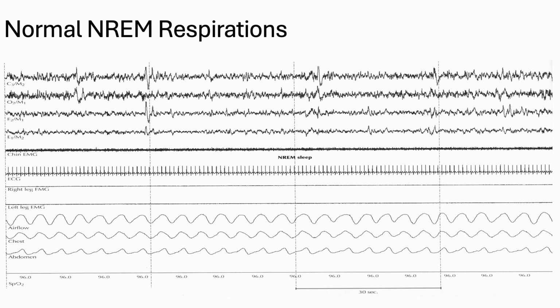Before we can really discern normal from abnormal breaths, let's look at normal breathing. This is a 2-minute window with 4 epochs. It's got those 4 big blocks of non-REM sleep and normal non-REM breathing. You can see an even and rounded morphology with the airflow. The effort belts are in sync and deflect with parallel motion. They're not paradoxing, or going against each other. They're going up and down at the same times. There are no desaturations in the oxygen sensor. I don't see a snore microphone, but snores can also show signs in the effort and airflow, so I don't think there are any. This is normal sleep.